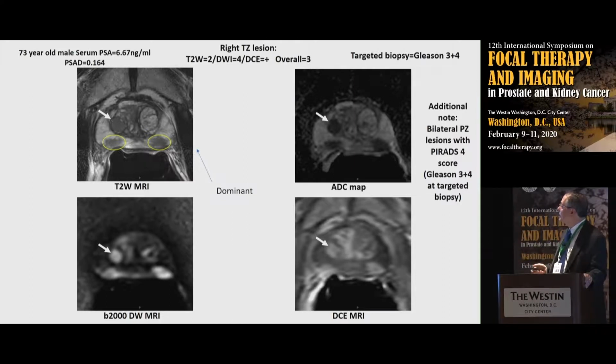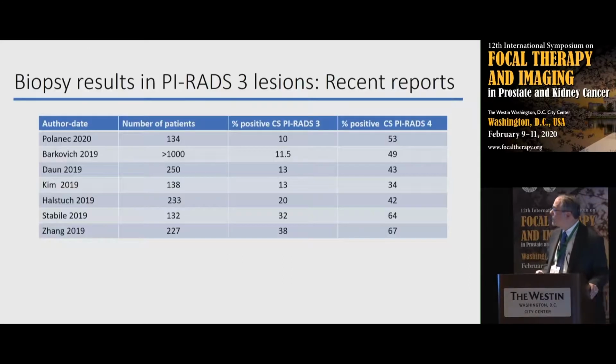And this turns out to be a Gleason 3+4. So I don't know if you all agree with what we called, and that is essentially my point, that it's a little variable, it's a little bit difficult. On a 5-point scale, you'll get a lot of agreement at 1 and 5. You'll get less agreement at 2 and 4, and the worst agreement will be at 3, right? So that's just the way all 5-point scales work.